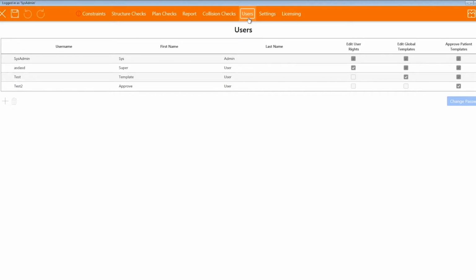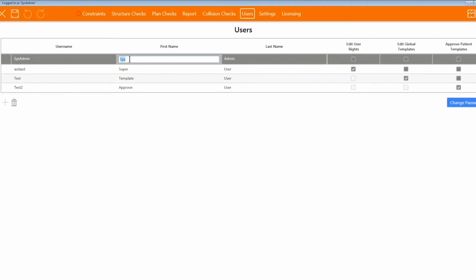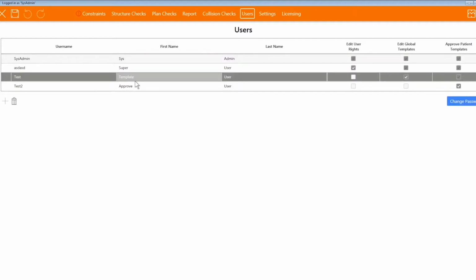The Users tab allows admin users to be added or deleted. Note that all Eclipse users will have access to the ClearCheck plugin in Eclipse. An admin account is only needed for those users who will be configuring the departmental settings for ClearCheck. You may edit the names for an existing user by double-clicking in the appropriate line. If an administrator needs to change the password of an existing user, highlight the user and click on the Change Password button.